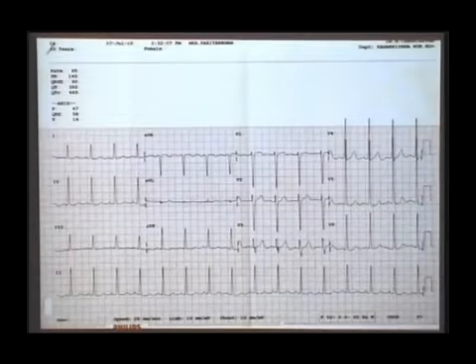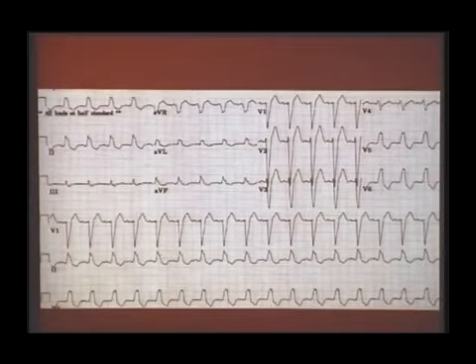Right. Now you can look at the ECG here. See the QRS amplitude here: 1, 2, 3, 4, 5, 6, 7, 8, 40 millimeters. What does it mean? Exceeding 26 millimeters is abnormal. So this ECG tells you ventricular enlargement is there. Whereas see the QRS duration here. What is the duration of QRS here? One big square. One big square means what duration? 0.2 seconds. The normal duration is 0.08. Here the QRS is wide. What diagnosis is this? Bundle branch block.